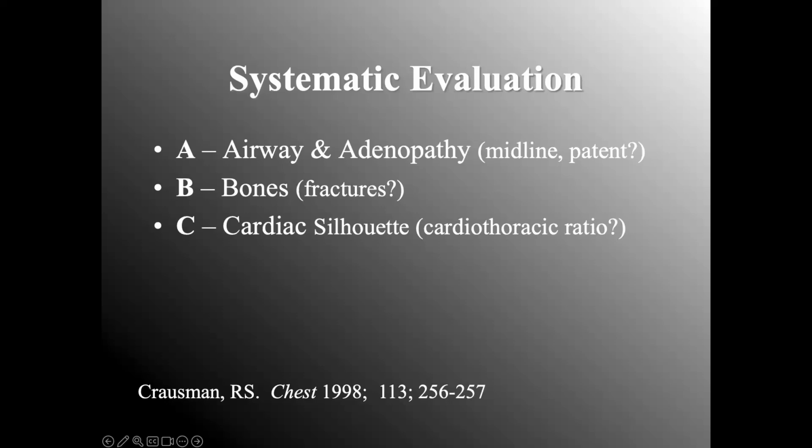So I have a question here on the screen, and you can answer it amongst yourselves there, but what is a normal cardiothoracic ratio? In other words, what is a normal transthoracic diameter to transcardiac diameter? What's the proportion that the heart should occupy in the chest cavity when we're talking about looking at just a single image from a frontal plane? Well, it should not occupy much more than half, and most radiologists would agree anywhere from 55 to 60% is that gray area, pun intended, where we consider maybe we're on the verge of cardiomegaly, but not quite there.